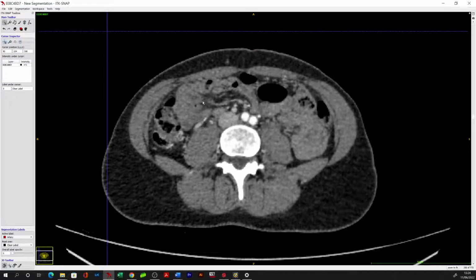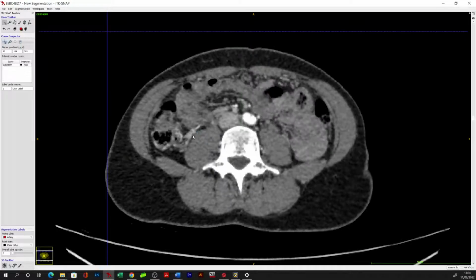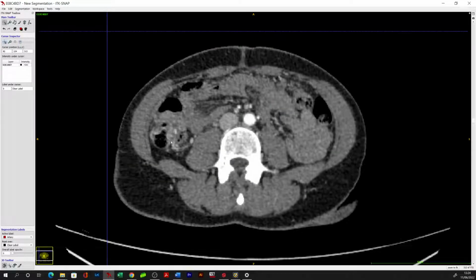This will continue probably to the right colon as what would ostensibly be called a right colic artery, although in our naming schema we don't name it as such, because if we're taking the vessel centrally, we in theory should not encounter this bifurcation. And the lower vessel here is coursing down towards the cecum.